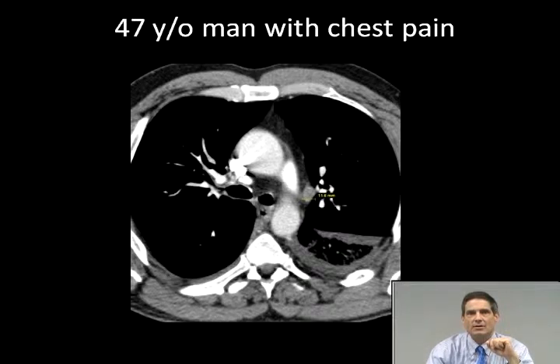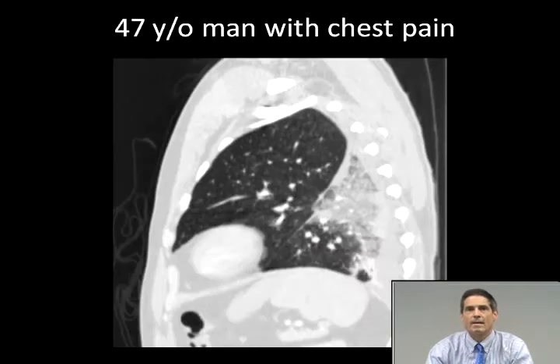And here's the same fellow with the chest CT on slide 89, filmed at soft tissue rather than chest windows, and you can see that the ground glass opacity sort of goes away. The effusion fluid along the oblique fissure and posteriorly stands out more on this picture. The arrow here is on a mildly enlarged hilar lymph node, not infrequently seen in those patients with this condition.